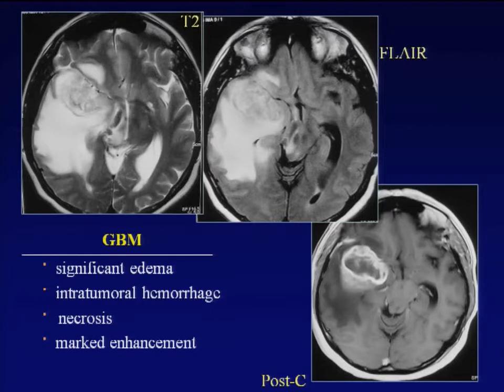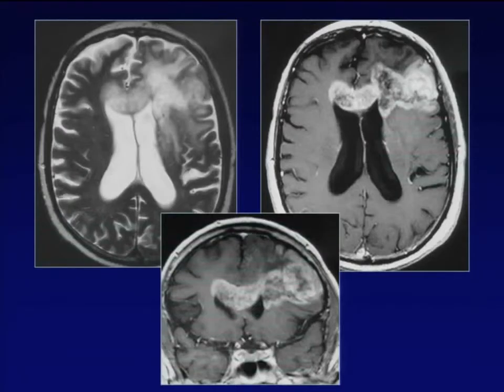We know from histology that dealing with primary intraparenchymal brain tumors, we have fingers of tumor along the perivascular spaces, not only outside the rim of enhancement, but some people believe well beyond the area of abnormal T2 hyperintensity. We may see tumor there. That's why the advanced neuroimaging techniques are very useful. And this is the typical butterfly appearance. It's well seen on coronal views. This is the tumor crossing the corpus callosum, going to the other side, the butterfly appearance.